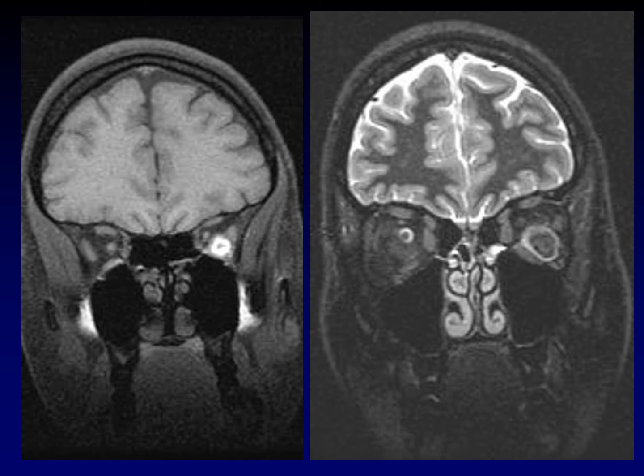Here's another patient. In this patient, on an unenhanced T1 weighted image, you can see that there is laminar bright T1 signal. And in a slightly different cut, you can see again on T2 that there is laminar signal with darker signal in the central area and brighter signal around the outside. Not a lot of things cause bright T1 signal in the orbit once the fat's been suppressed. And this laminar appearance is also characteristic of a thrombosed varix.